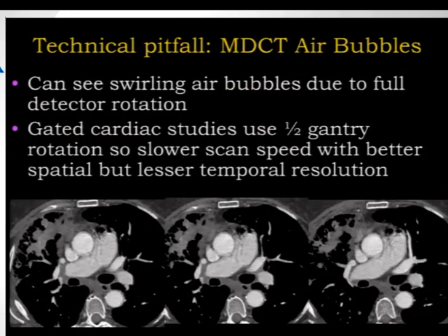There's another pitfall which you may or may not have seen, and that is these linear opacities, and mostly residents fall into that particular pitfall, and that's actually an error of the scanner itself, the detector rotation.